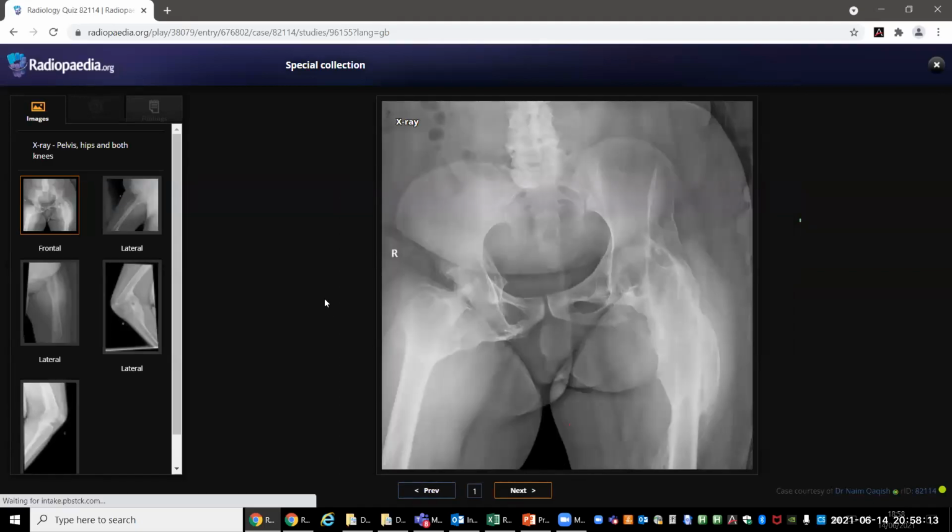Okay, I'm provided with a plain X-ray of the pelvis. The upper femur, specifically the left one, the tubulation is disturbed in the femur, with the femoral head also not well seen within the hip joint. I think the hip joint is disturbed. There is loss of the space in the joint, and there is a diffuse sclerosis.